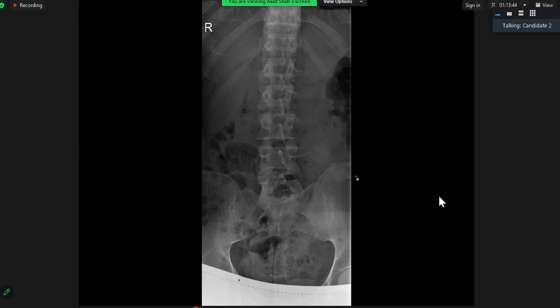Absent pedicle, congenital. But if one is absent, the other gets hypertrophied, isn't it? Yeah, the other looks normal. All of you can see it, I hope. You spotted it straight away. That's good. In your normal practice, when you are reporting X-rays at your workplace, it doesn't always come to you, but if you look harder, then yes, it's there. It's always good practice to look at the pedicles.